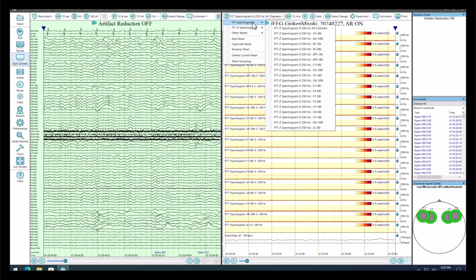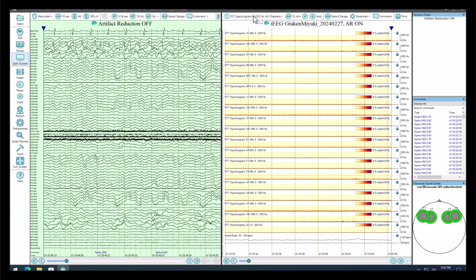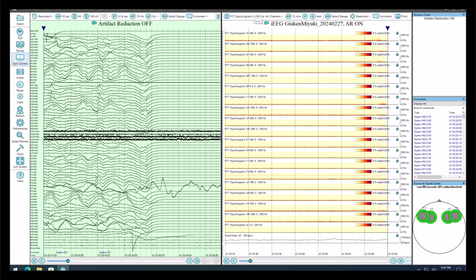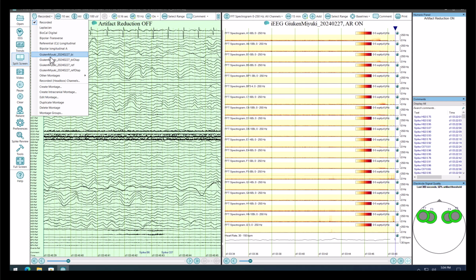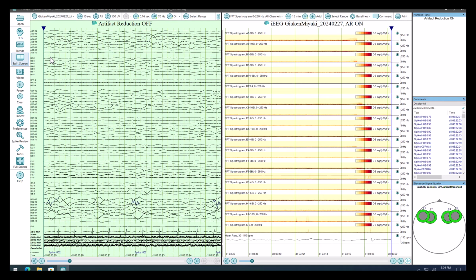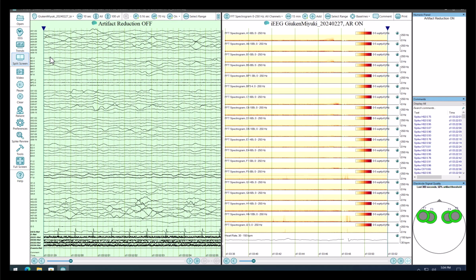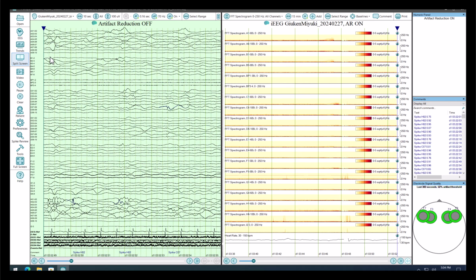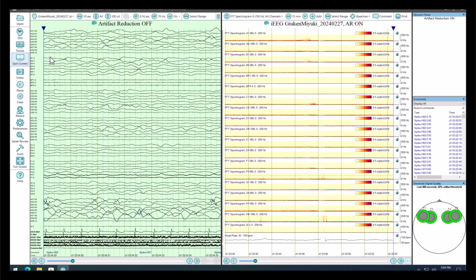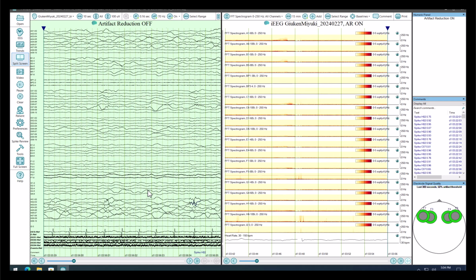And we'll talk about that a little bit more as we go further. But what the FFT spectrograms do is they look at the EEG at each one of the frequencies by bin, and it calculates the amplitude by frequency. So we have FFT calculated by amplitude from 0 to 250 hertz. And we typically have much more amplitude in lower frequency ranges than we do in the very high frequency ranges. And so we can see changes at the lower frequency spectrum.